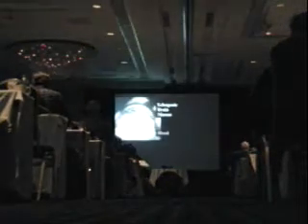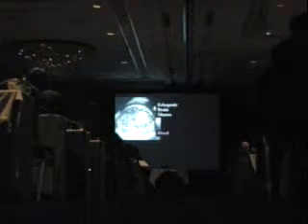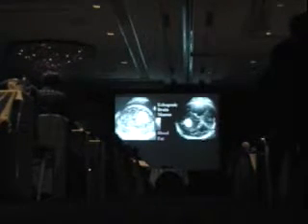So, now let's look at masses in the brain. Echogenic masses in the brain. What is echogenic by ultrasound? Not a whole lot of things. There's really not a lot, okay? There's blood. There's fresh blood. And this is a fresh bleed in the parenchyma of this fetal brain. There's fat. Fat is echogenic.